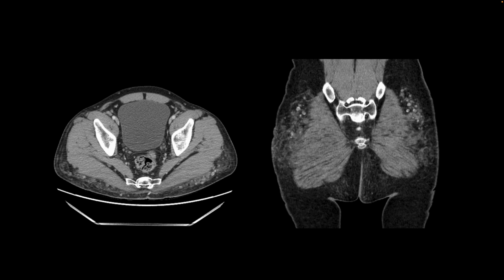This is our next patient here. The interesting finding, incidental, was that in the subcutaneous space in both buttocks there are these hyperdense foci surrounded by fat stranding, and so on the coronal image we get a better sense of these multiple hyperdense foci and fat stranding. And so these are from a cosmetic procedure. These are silicone injections for butt lift or enhancing the appearance of the buttocks, and they may lead to cellulitis and frequently abscess formation.